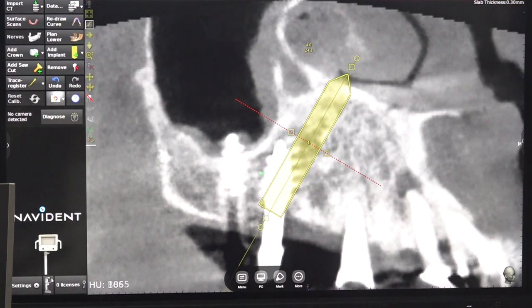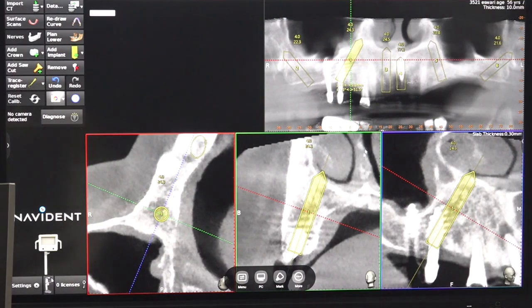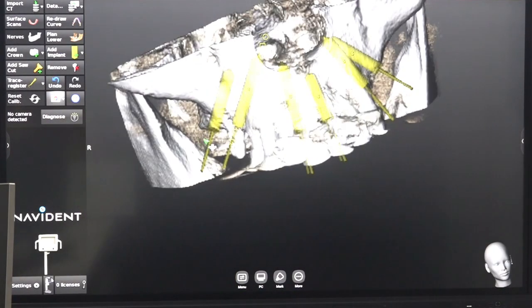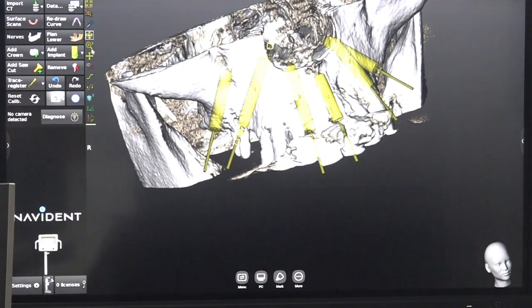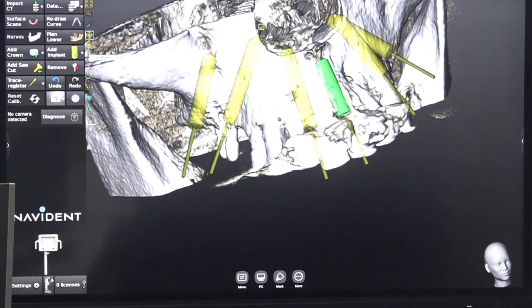So starting point we have defined. What is the ending point? How to decide that? So there are basically only three options in the ending target area. One is in the nasal corner. It is called the NC point, and another is in the nasal floor, and another in this area, the nasomaxillary buttress area, lateral to the lateral nasal wall.